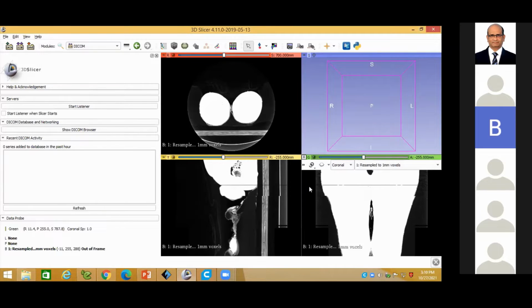And now you can see these are the legs. I extracted the hip and the legs, this whole body, as DICOM images. The DICOM images are imported in this 3D Slicer. In the medical community, when we look from top to bottom, they call it the superior to inferior view, from top to bottom.